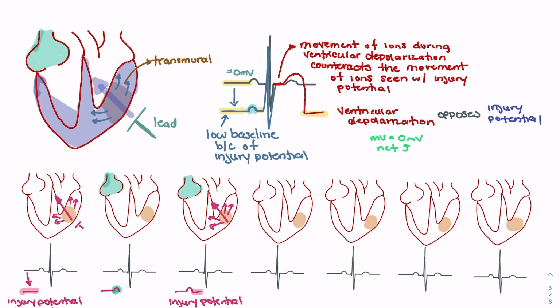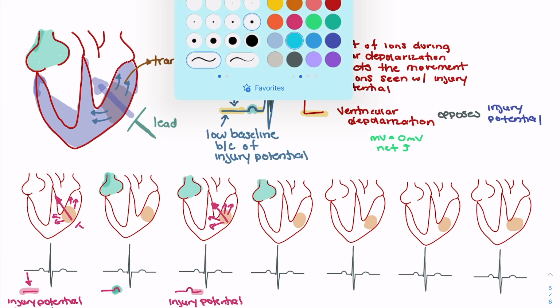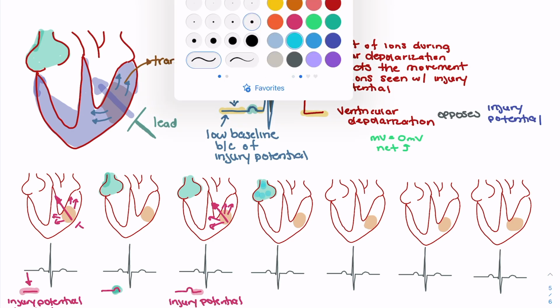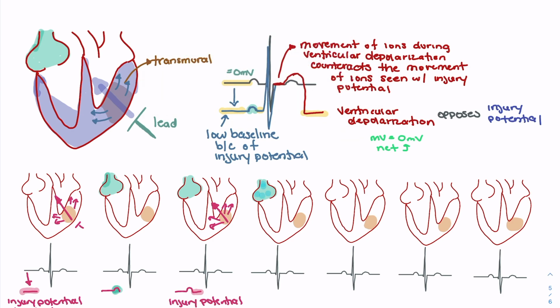Now, the next portion of our ECG is our QRS complex. What's happening here is we're seeing repolarization of our atria, and we're getting depolarization of the ventricle. So we start to see depolarization of our ventricle, and we get our QRS complex. So again, we've got our P wave and QRS complex, and we know that's the result of atrial repolarization and ventricular depolarization.